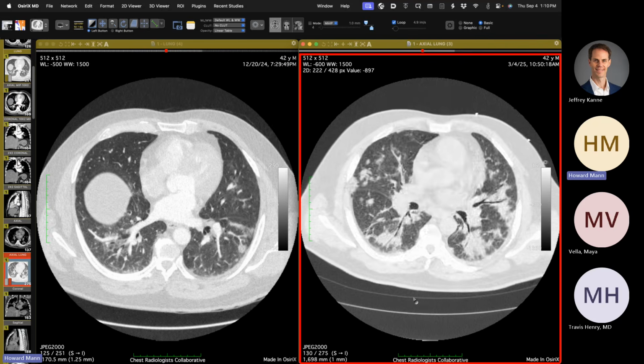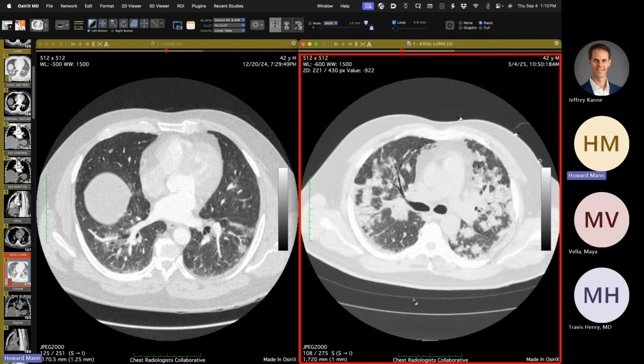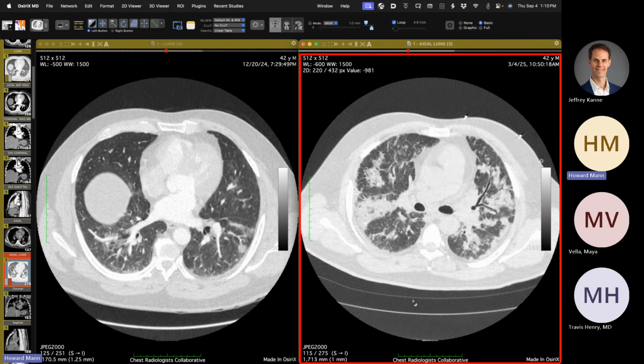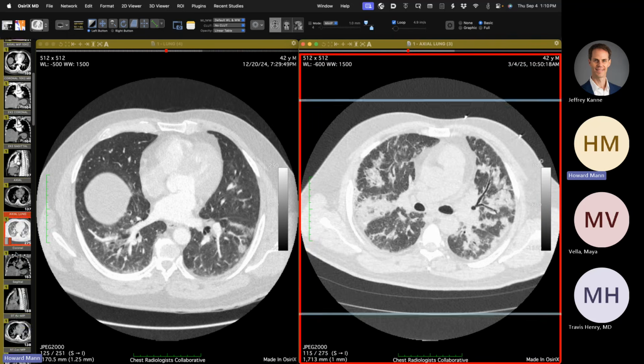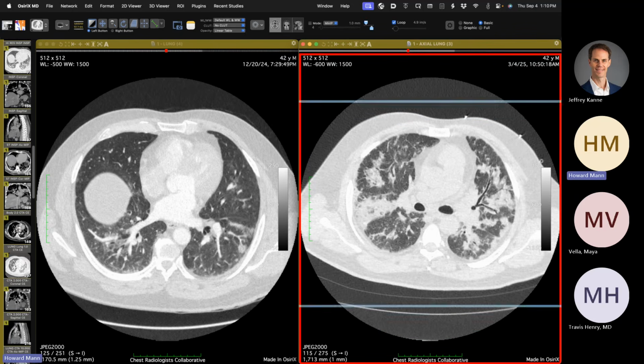So certainly just based on this, multiple differential diagnoses exist. It's not suggestive in my mind of any particular thing, and one needs more information. But let me go forward in time now from March to, I've got a lot of images here, so let's go to April.